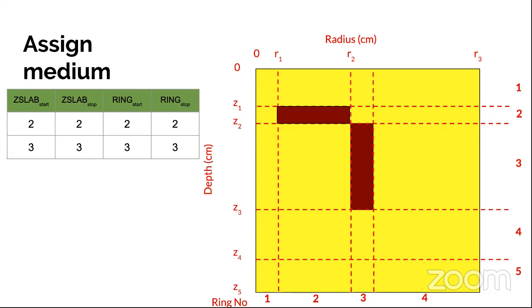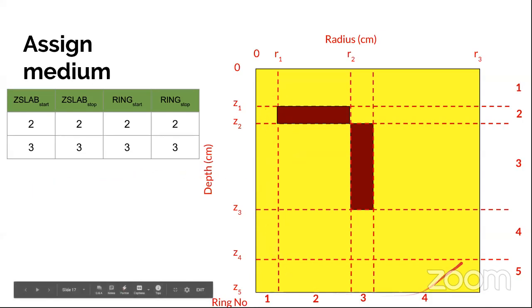The code reads line by line. So for example, if we put another material here and we put 1514, all of this is gone, because then it's going to populate that medium in all of these zones. So whatever you have here, they're gone. Okay.